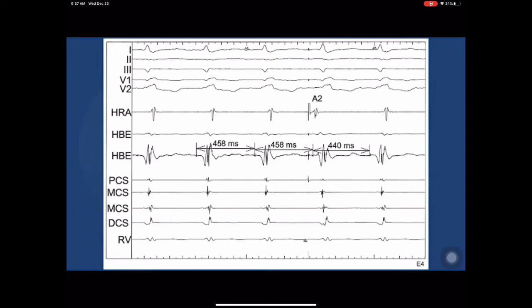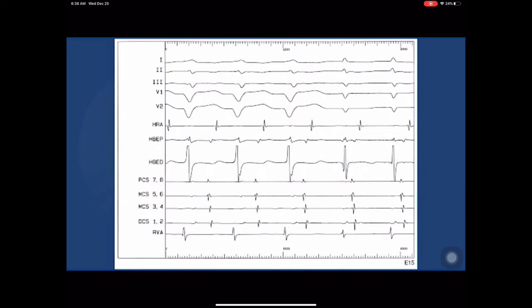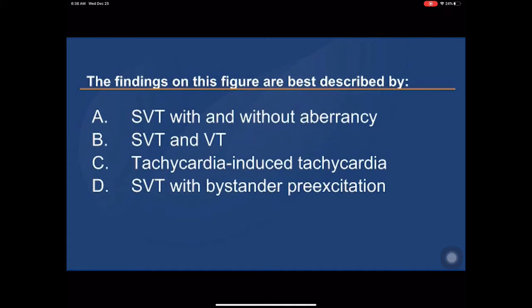So now let's go on to our next case. Now, this is a case of a patient in the lab, and I took out one piece of a tracing. So this is a patient who has on the left-hand side 3 wide beats, and on the right-hand side 2 narrow beats. So you're going to have to measure and take a look at it, and here is the question that I'm asking you.